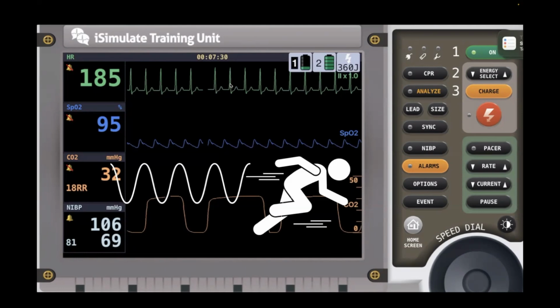SVT is a blanket term you'll commonly hear thrown around. It's supraventricular tachycardia, a tachycardia above the ventricles. So tachycardia is a rate above 150 that generates from above the ventricles, so narrow in nature. This person's in rapid atrial tachycardia. This is your adenosine patient. You've heard people say, "Let's give him some adenosine." This would be a prime candidate for adenosine.